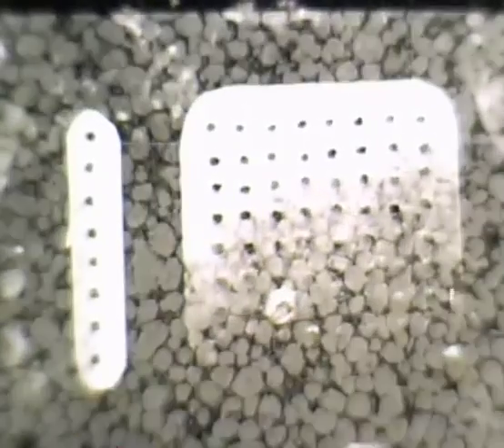The structure, or spatial grain of this activity, is much finer than the grain of spatial activity revealed in the surface distributions of the evoked potentials, or the EEG. Therefore, the surface recordings of the spontaneous and evoked potentials have limited value.